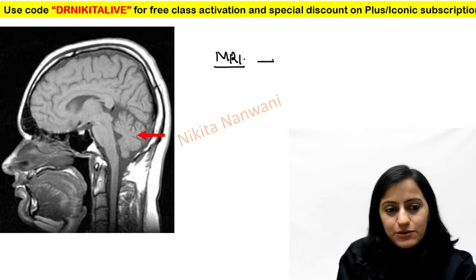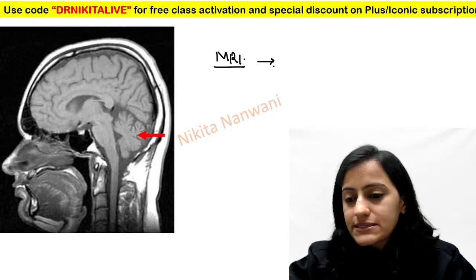We'll come to MRI sequences, but can someone tell me what MRI sequence this is?